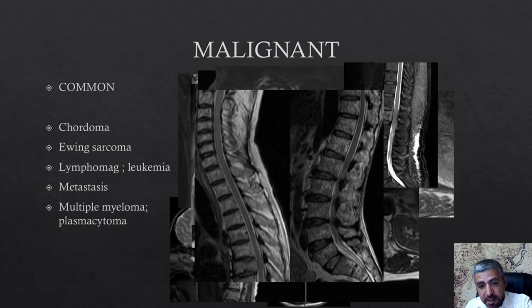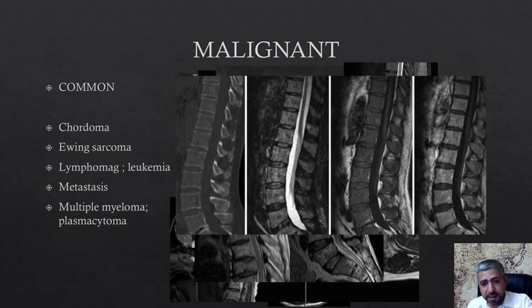Like you can see here, the multiple myeloma are a billion tiny lesions involving all the vertebrae. Okay, and usually it is in the 50s to 70 years old, something like that. So in the more adult population, you can see multiple, the whole bone marrow is abnormal, and this is a feature you can see in multiple myeloma.